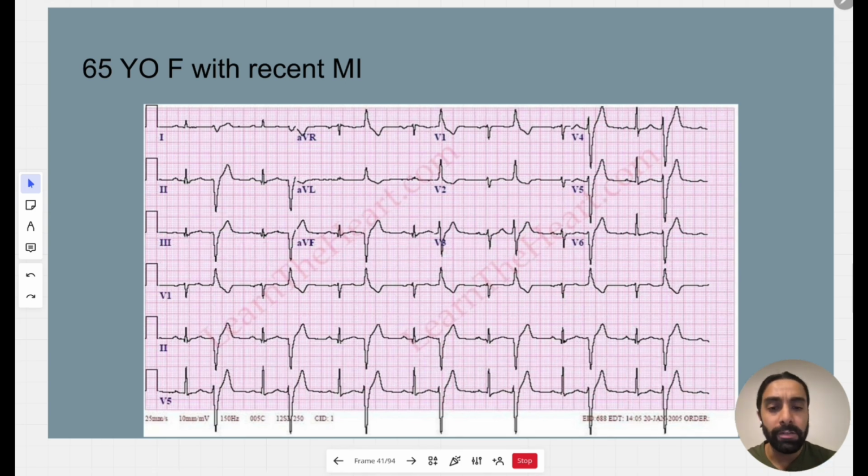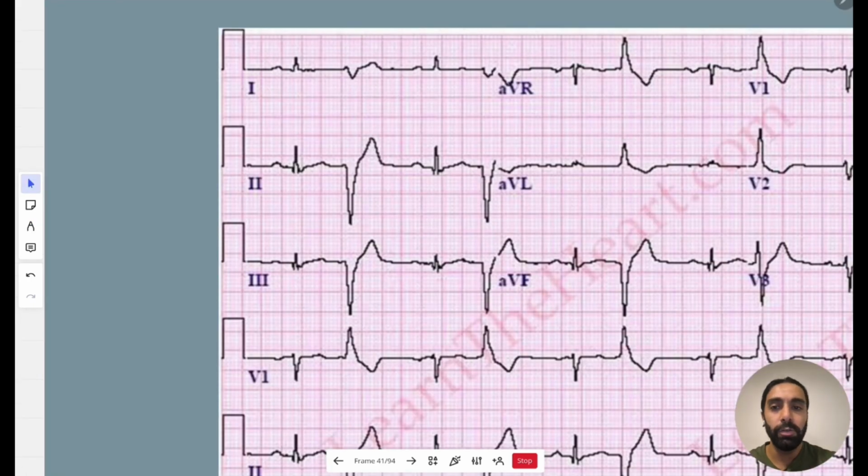So you can already tell that it's abnormal just because of these abnormal rhythm beats that are forming. But if you count all of these, it's supposed to be 74, so that's normal, at least for the rate. The rhythm, you see there's this abnormal QRS that's being generated every other beat. And if you look here, you have a normal QRS, and then you have a widened QRS. So it is apparently normal, but then every second beat, you have this abnormal rhythm that's interjecting itself.